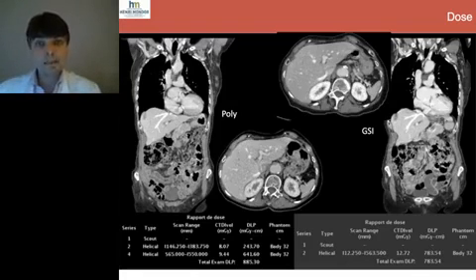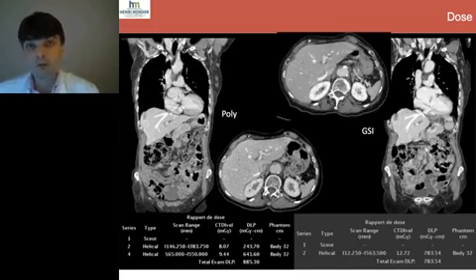But if you look at the dose exposition on a patient basis, combining the non-enhanced phase with the enhanced phase, well, you can even think that you can reduce dose using spectral imaging, because with that single acquisition, remember, you can make a virtual non-enhanced reconstruction and actually benefit from the non-enhanced phase without making the acquisition of the non-enhanced phase.